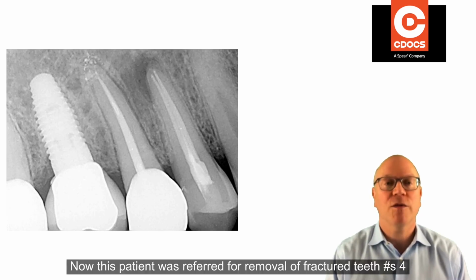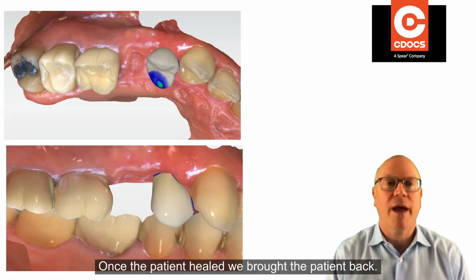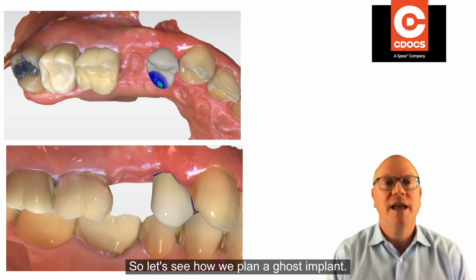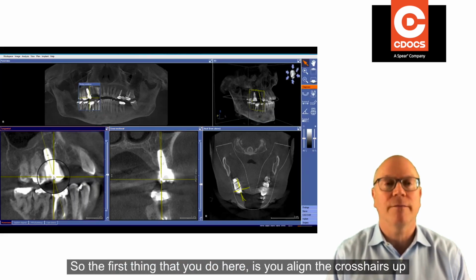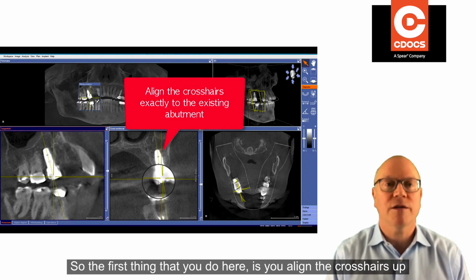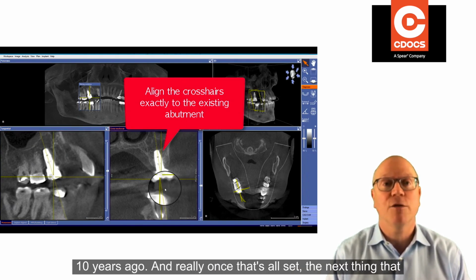Now, this patient was referred for removal of fractured teeth numbers 4 and 5 with grafting. Once the patient had healed, we brought the patient back, we got the CEREC scans, and we got the cone beam. So let's see how we plan a ghost implant. The first thing that you do here is you align the crosshairs right over tooth number 3, or the implant that had been placed about 10 years ago.